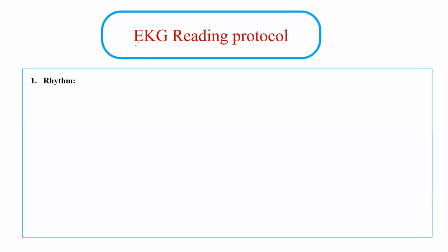In this video, we'll talk about EKG reading protocol, which is the same protocol that Dr. Paydak, who is one of the electrophysiologists, teaches his medical students and residents to read EKG systematically. To start with EKG reading, we will focus on 6 sections.